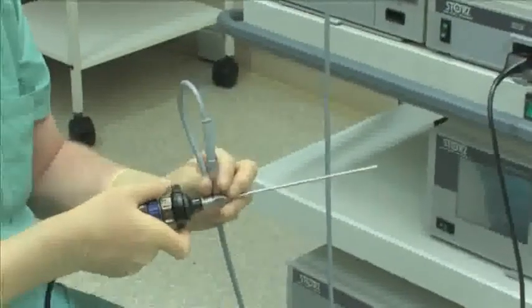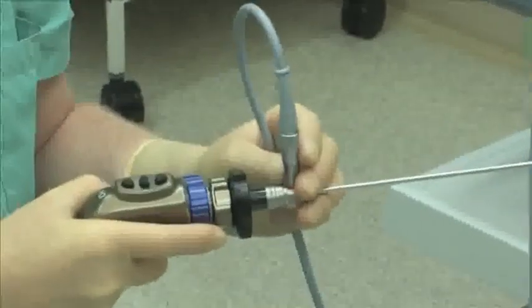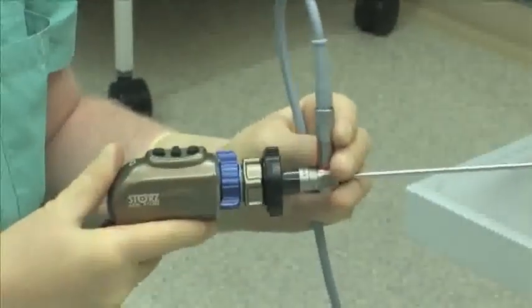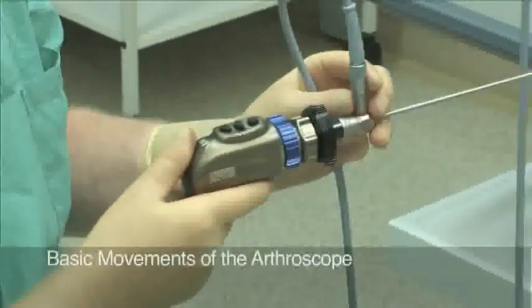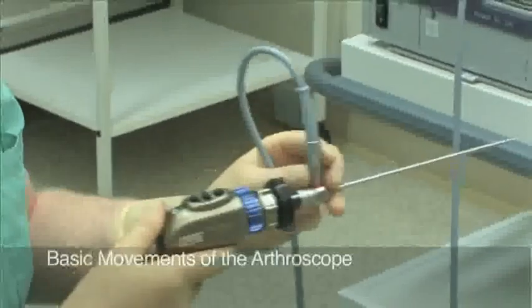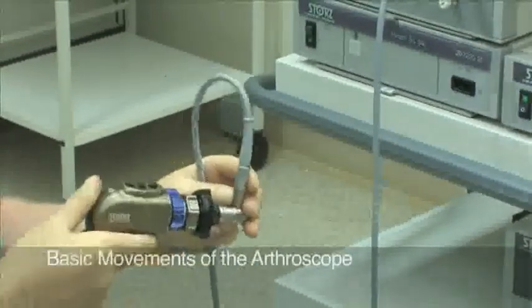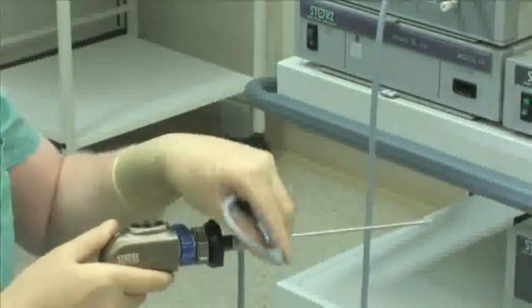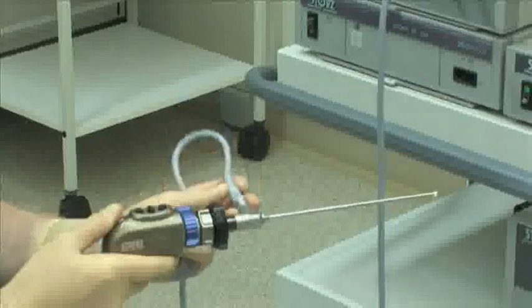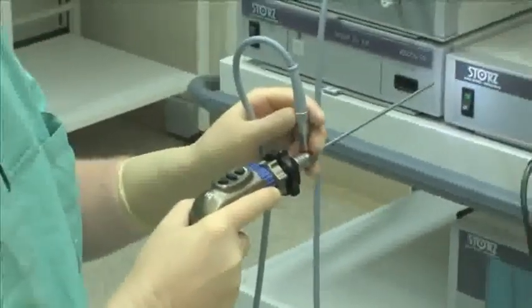For each arthroscopy, the video camera is connected to the endoscope to transfer the intra-articular images to the monitor. There are three basic movements that control the endoscope: advancing and retracting, turning upward, downward, and medially and laterally, respectively, and rotation. Initially, these basic movements are exercised at the arthroscopic tower.